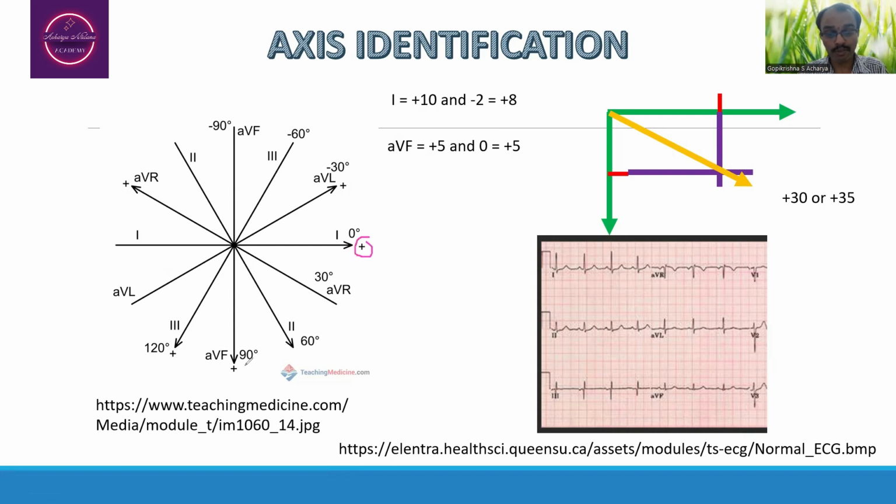And this is considered to be lead AVF. Here what we are going to note about the same thing, we are going to depict in the ECG picture.